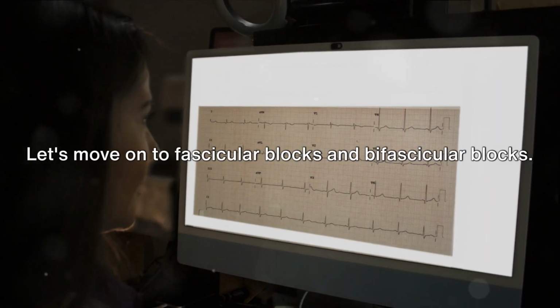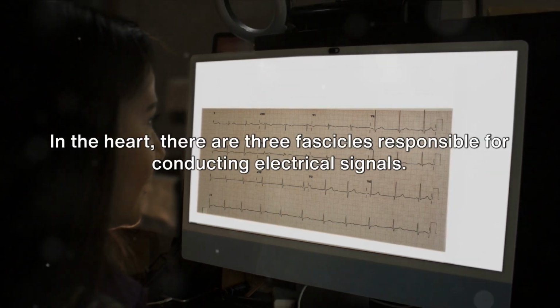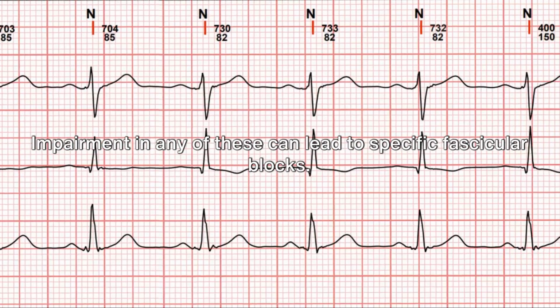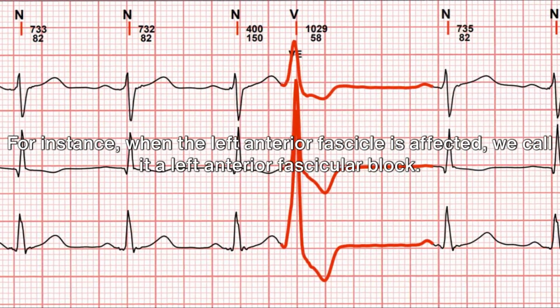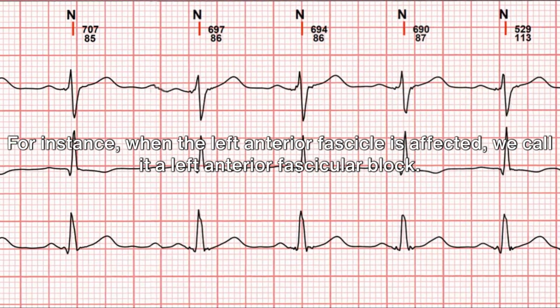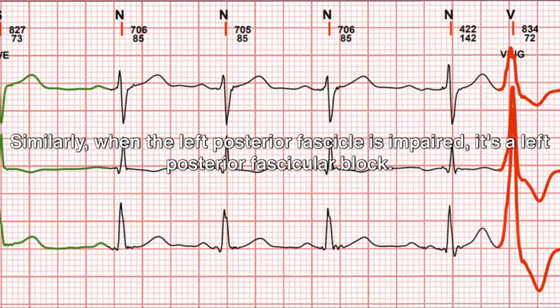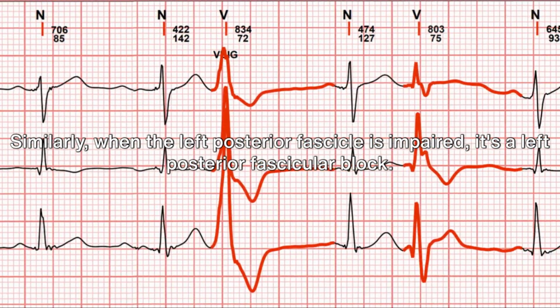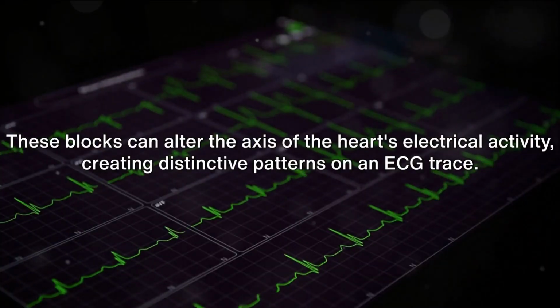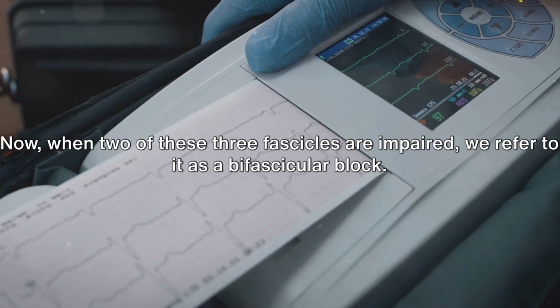Let's move on to fascicular blocks and bifascicular blocks. In the heart, there are three fascicles responsible for conducting electrical signals. Impairment in any of these can lead to specific fascicular blocks. For instance, when the left anterior fascicle is affected, we call it a left anterior fascicular block. Similarly, when the left posterior fascicle is impaired, it's a left posterior fascicular block. These blocks can alter the axis of the heart's electrical activity, creating distinctive patterns on an ECG trace.